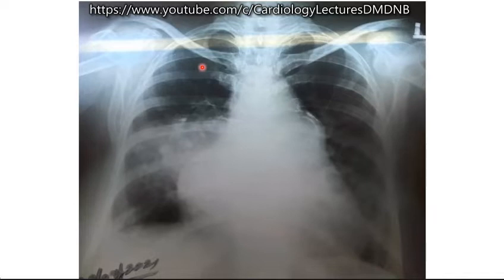Okay. In this X-ray, you have got evidence of the. Sir, we have to see whether there is any cardiomegaly or a normal cardiac shadow, and aortic dilatation, and any calcification, ductal calcification, or any less prominent aorta. So from these features we can decide about ASD or VSD or PDA. Okay. And what is your comment about this patient?